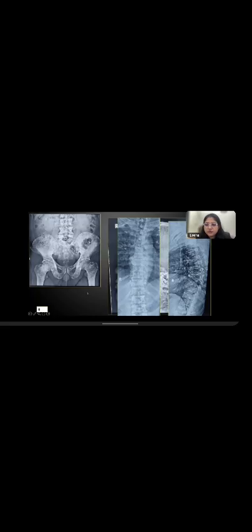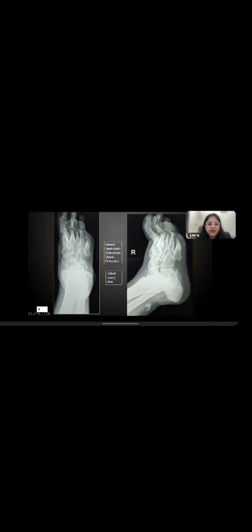Right. So case 8 was metastasis, mixed sclerotic lytic mets of CA prostate. Now case 9, I have already written the diagnosis. So you just have to see how you will describe this lesion. Now this is not a typical focal benign or malignant bone lesion, but I have kept it because this is an MSK class and the exam is on the cards.